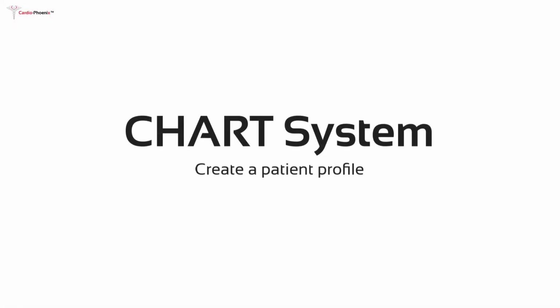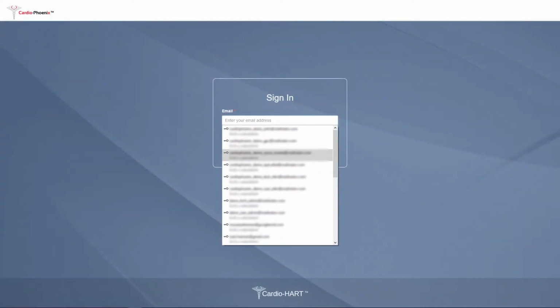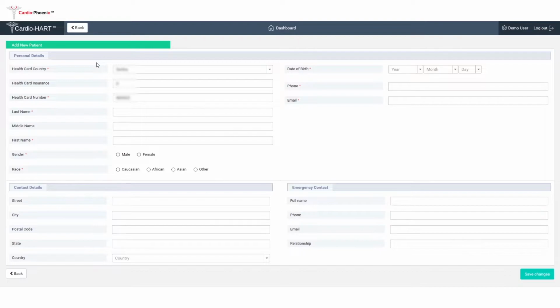Hi, in this video I will show you how to create a patient profile. The nurse will need to log in to chart.cardiophoenix.com with their email and password. Search the patient by health card number. If the patient does not exist in the system, the form will open and you can fill in the patient's personal information.